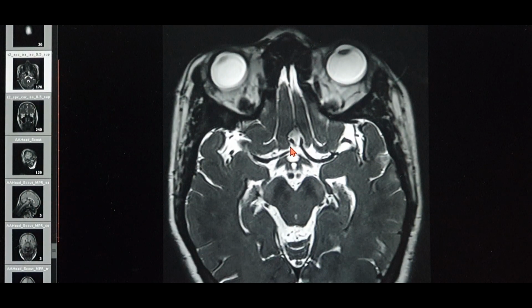So what I have taught you so far is the basics in the MRI brain and the PNS, the various different sequences and the windows. I've taught you the MR venography, the anatomy of the dural venous sinuses, how the sinus network is formed, which sinus leads to another. Because trust me, many students do not know this even at the level of PGs. In the exam they do not know how the sinuses are actually formed. So I hope this is very clear to you.